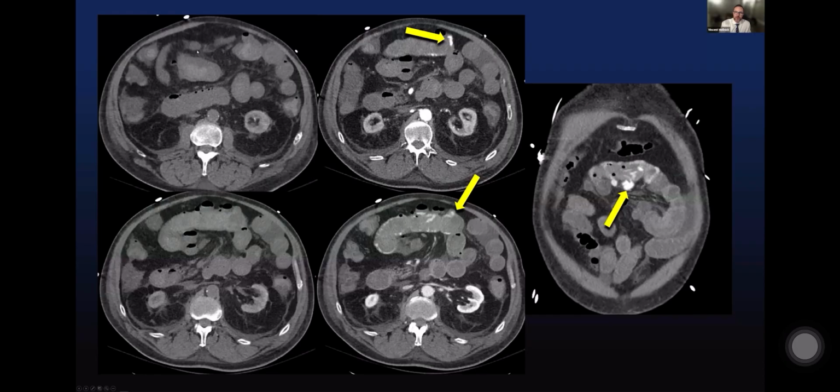I think it's very helpful to notice that, number one, we did a pre-contrast scan, so we aren't going to be fooled by things like calcium or pill fragments within the lumen. Number two, it helps us identify this freshly clotted blood within the small bowel, distending it. Most people with brisk bleeding into their small bowel have a cathartic type phenomenon, so it doesn't make sense to have completely normal looking small bowel with a small focus of active extravasation. This person is bleeding on our CT scanner because they've been bleeding before they got on the CT scanner too. We're not just capturing it beginning.